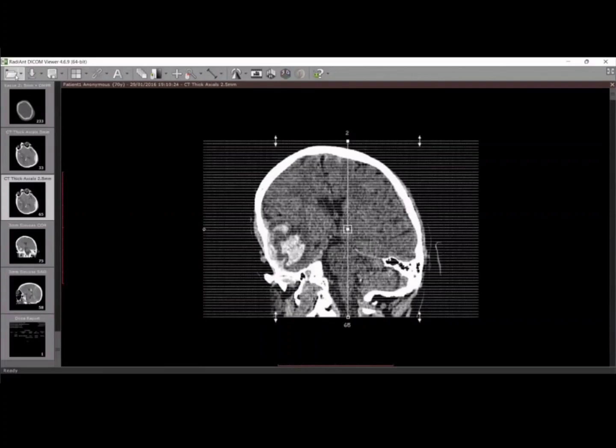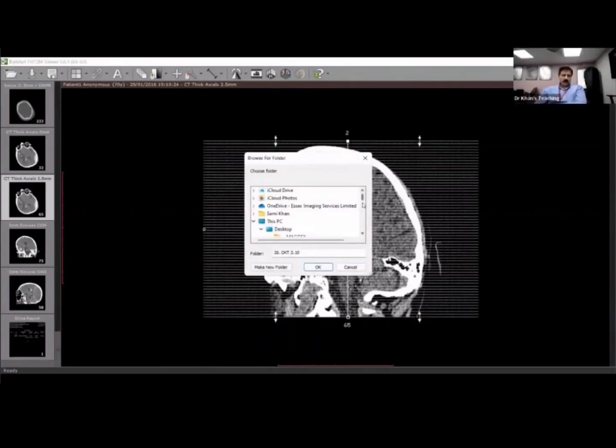Okay, that's fine. I want to just show you the last case. It is a satisfaction of search case, but I will guide you because of the time factor, and I will tell you what to look for. Last case of the day.